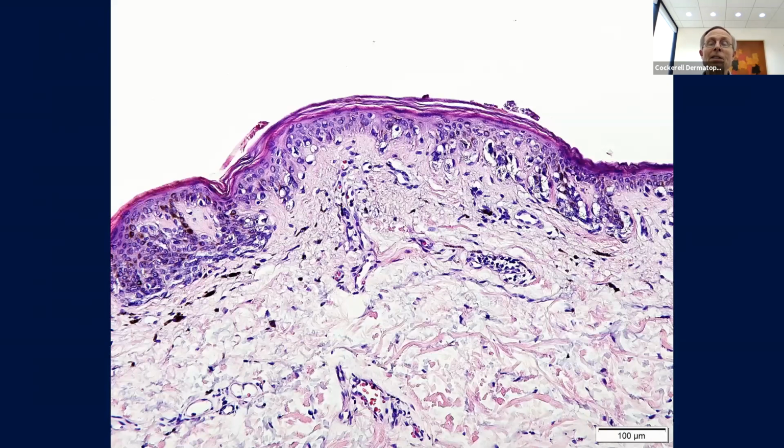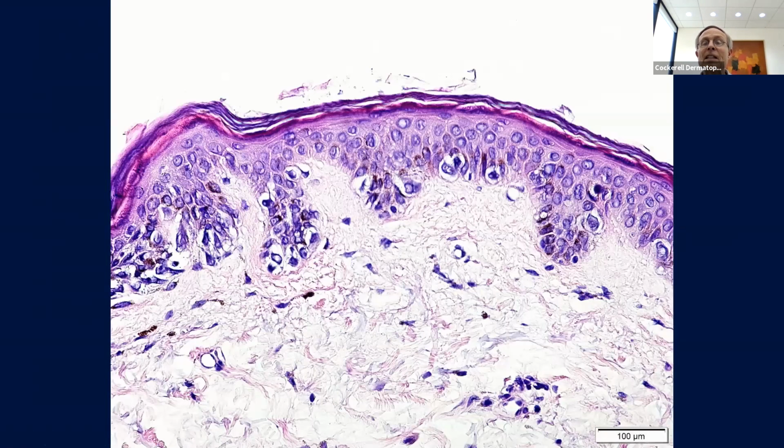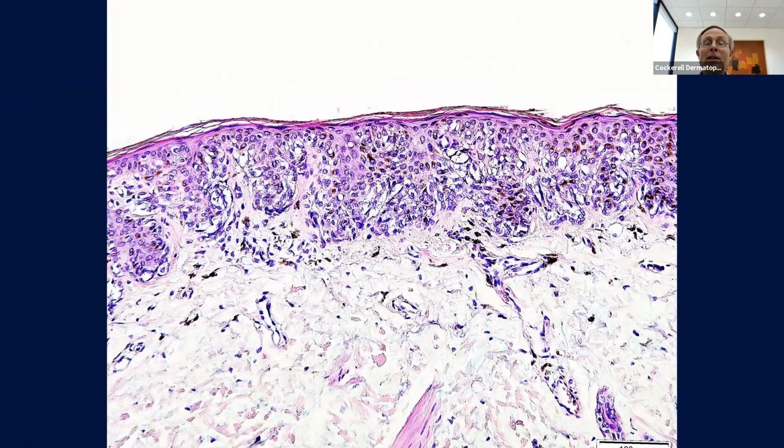So when we see melanocytic lesions on sun-damaged skin, and they're broad in older individuals, we get concerned about the diagnosis of melanoma in situ. So here you got features that look like a dysplastic nevus, but in others you got some single melanocytes and maybe a few cells that are above it. You always have to take these things in the context of the breadth, the symmetry, the circumscription. So if you just had a punch biopsy out of a lesion like this field right here, this is not enough to call melanoma.